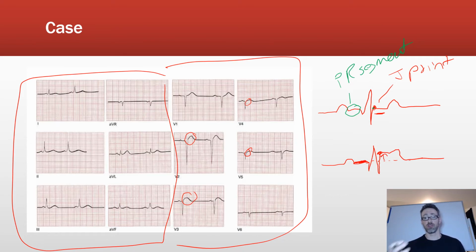In addition, you can go a little bit further to see what coronary vessel might be affected. So, for example, if V2, 3, and 4 were our ST segment elevations, it's an anterior STEMI, and then I could say the coronary most likely to distribute to that is probably the left anterior descending. Okay, so this might be some sort of an obstruction in the left anterior descending, because that's the part that goes down the septum. Okay.